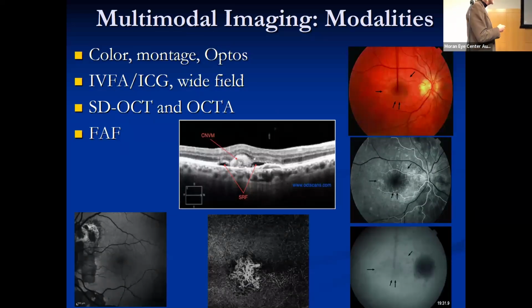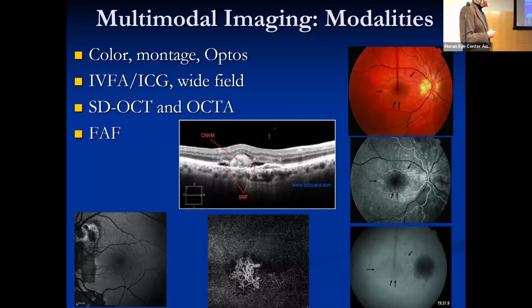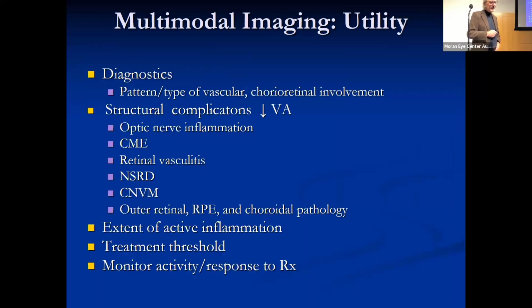Of autofluorescence down the bottom at the border of a patient with serpiginous choroidal neovascular membrane, and OCTA of that membrane, and then little white dots, which are more visible in a wreath-like configuration and are visible on ICG in a patient with MEWDS.